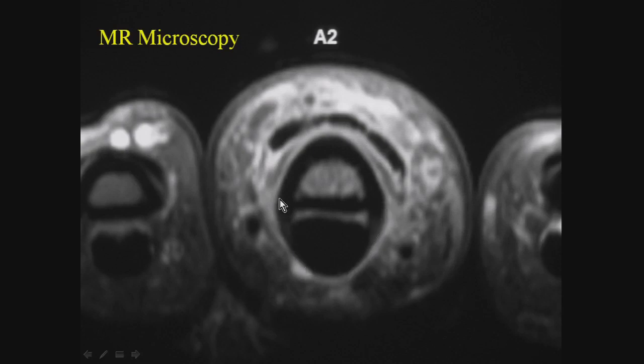So here we're at the level of the proximal phalanx. You see this sling that's wrapping around the flexor tendon apparatus. You can see the extensor hood mechanism and nicely see why it's called a hood, the way it fans out here dorsally. The central slip that's located here.